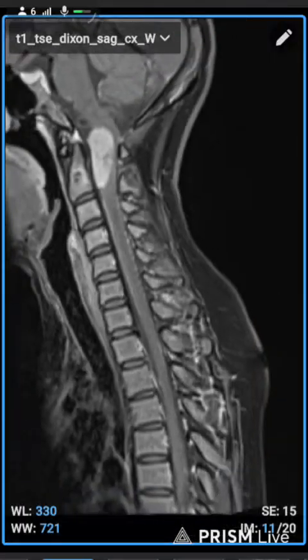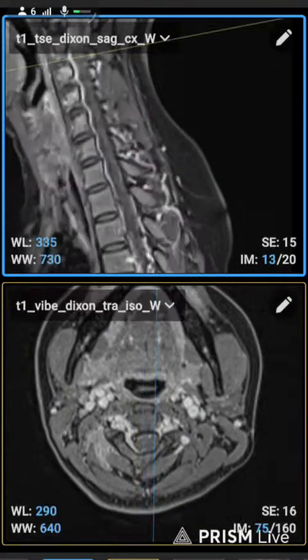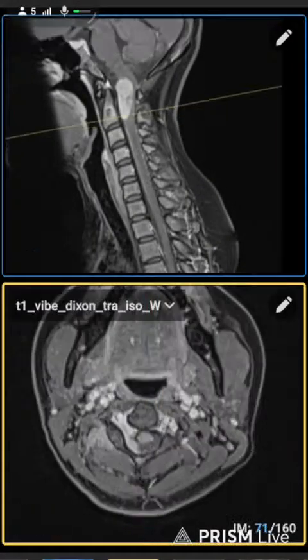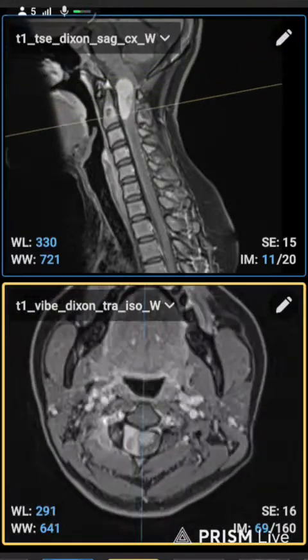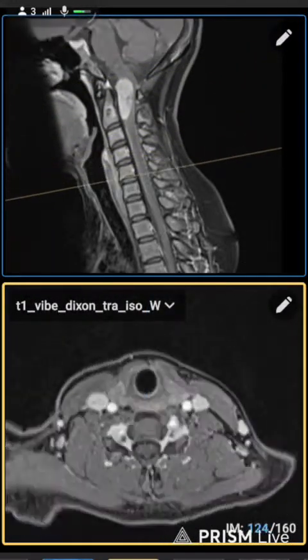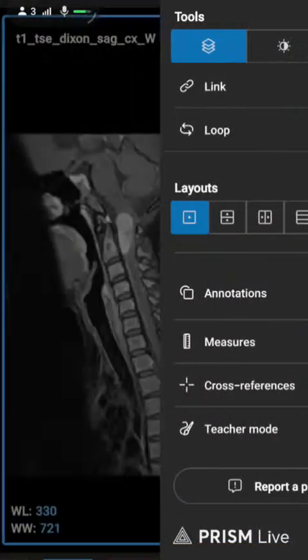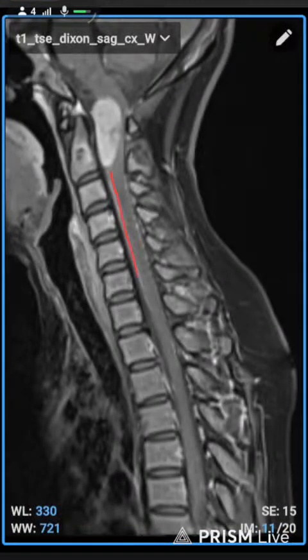So we can take every expected area of the lesion. So we find out in sagittal the line was ended in here, so we plan everything in this case.